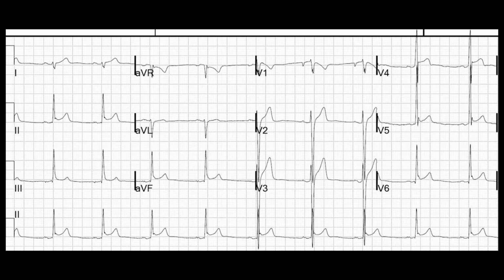Okay, take a look at this one, scan it. I see some mild ST elevation in V3, V4, V5, but it is smiley face in nature. The QRS in V3 is down, the ST segment's up, so that also would be appropriately discordant. I see the notching fishhook pattern, very prominent in V5, so there's your Osborn wave telling me this is benign early repolarization. This is not STEMI.